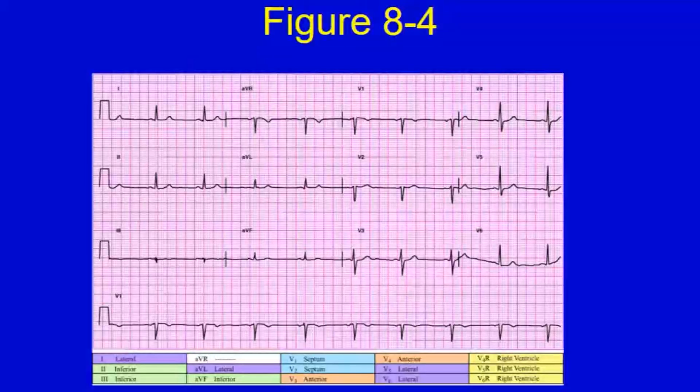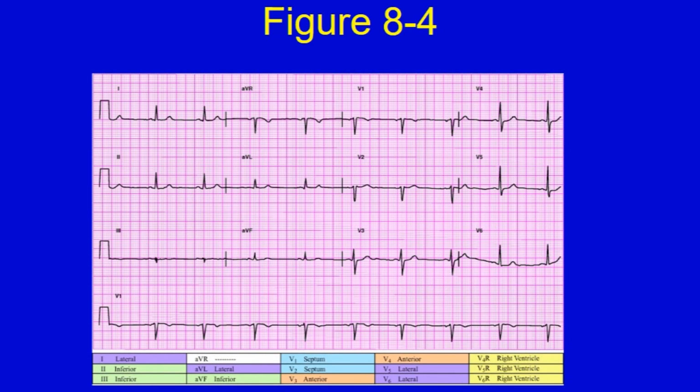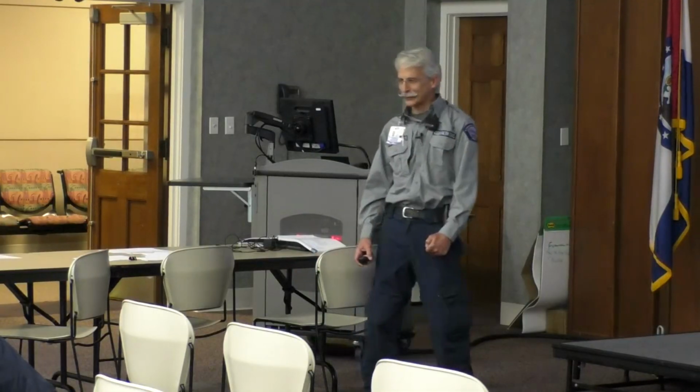So, what's the rate and rhythm on this thing? I heard 90 and I heard 56. That was interesting. This is a 10-second strip, and I'm going to tell you 56 is right on the money. 56 is dead on it, not 90. What you were doing was counting them all and multiplying by 10, instead of multiplying by 6. You won that one. Yes, I was right once.